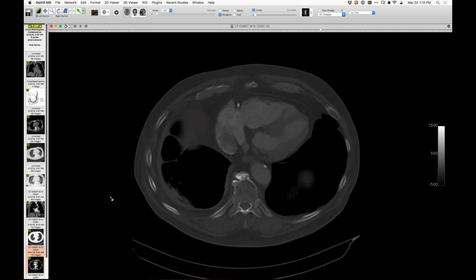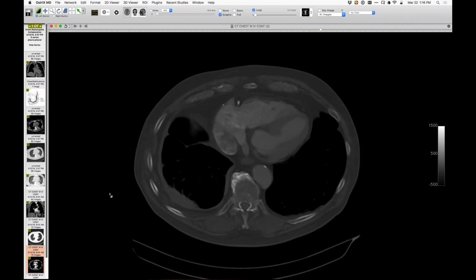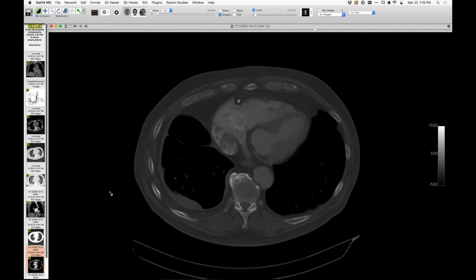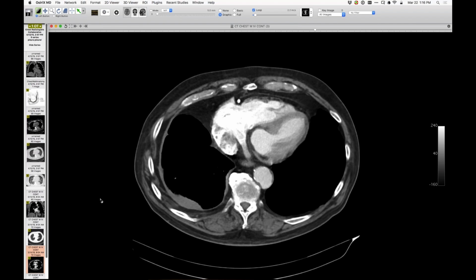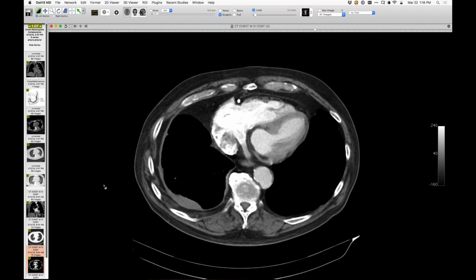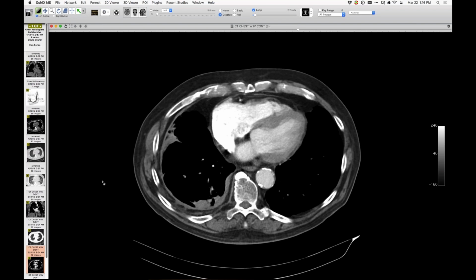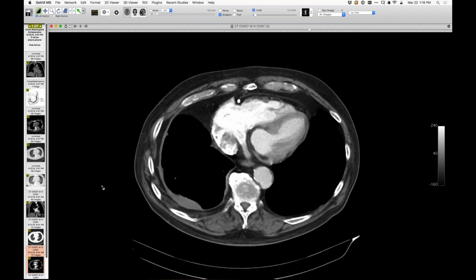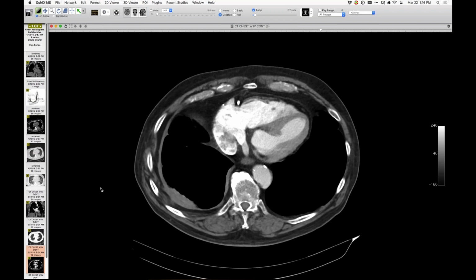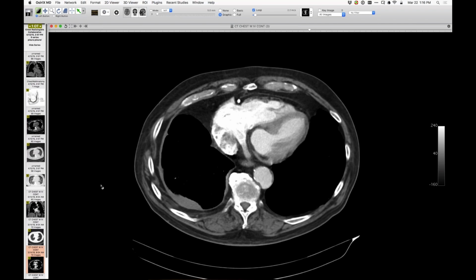Well, I think when you have volume loss of any thorax, you get the extrapleural fat getting kind of pulled in. I mean, you see the same thing with fibrotic lung disease. That's one of the findings you see with severe UIP patterns or whatever. You see the same thing where adjacent to the fibrosis, you see this prominent extrapleural fat. Yeah. And pathologically, they even see it too. They see a prominence of the fat adjacent to the fibrosis. Yeah. So I don't know if it's real hyperplasia or hypertrophy. Those are the good words to describe it, but just a lot of fat there and pulled in maybe.